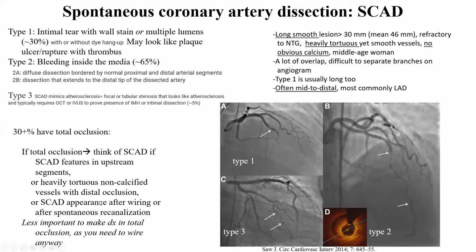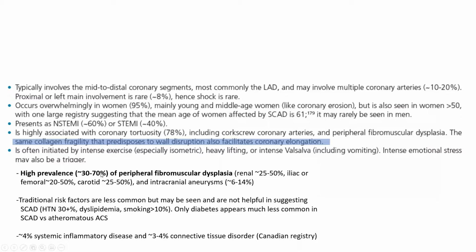Like I said, it's less important to make the diagnosis in total occlusion, but it's still important because you can wire it and just balloon, not stent it if you think of SCAD. And I will elaborate a little more on that.